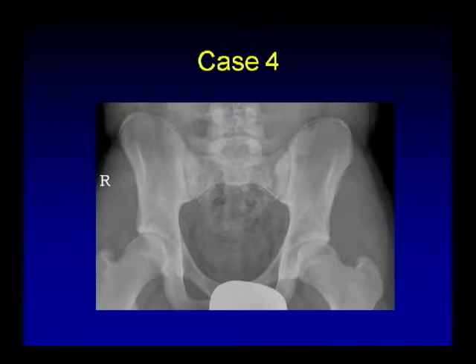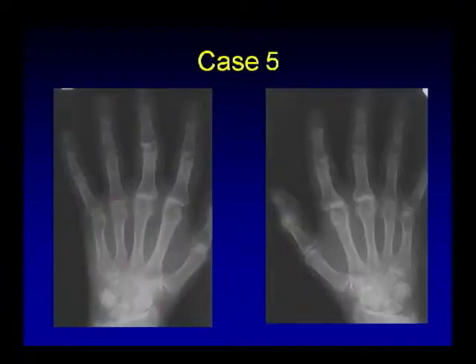I think we can see it even with that. Some back pain. And I see this a lot in young people with back pain. And the last one. What is going on with these hands, and which joints are narrow? That should help you figure out. That's going to be a theme throughout the talk. Narrowing. Where is it located? What types of erosions do we see, if there are any at all? Any little clues here? Okay, so we'll revisit those in 43 minutes.